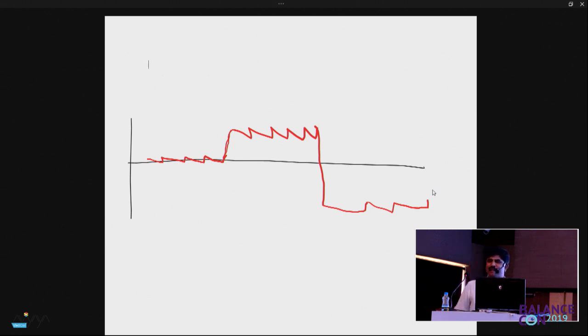So this is a typical direction fixed nystagmus. Whether you look to the left or to the right, direction is not changing. Direction remains fixed. But what changes? The intensity changes. This is the nystagmus which is considered to follow which law? Alexander's law.